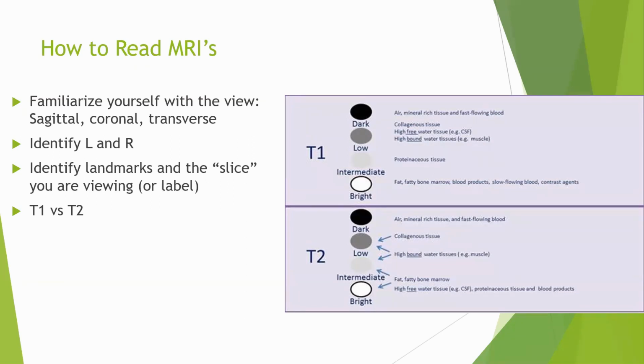You are looking at the scan from inferior to superior, foot towards the head, and then it will be easier for you. So it is exactly opposite of your anatomical position. Your left on the scan is the patient's right, your right is the patient's left.